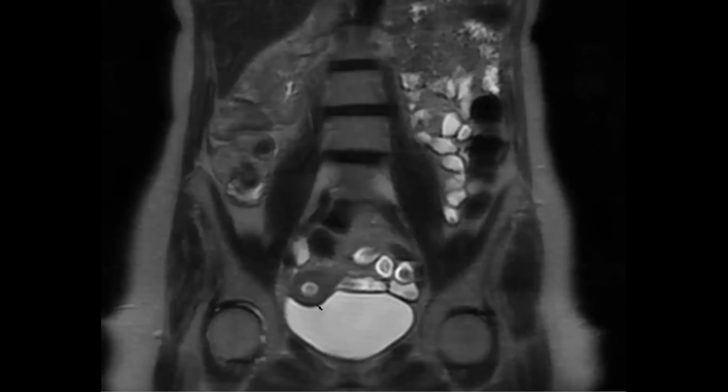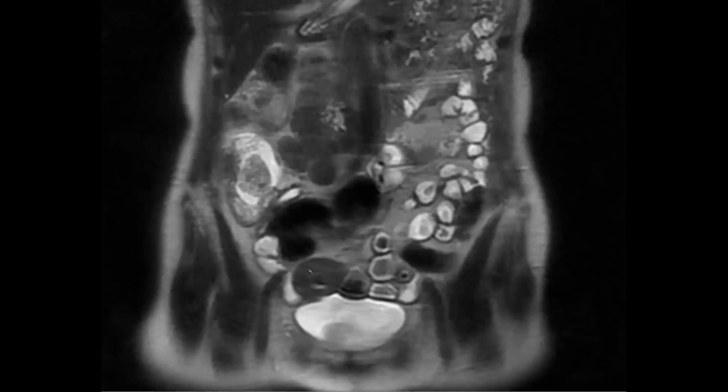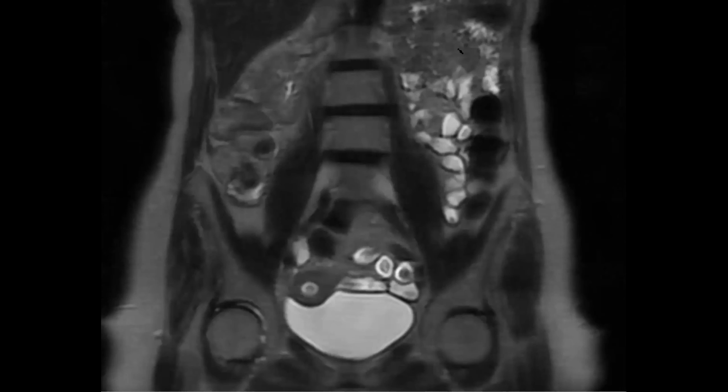And yeah, this kind of thickening without obstructing the lumen is more typical for lymphoma than like a malignancy, but definitely like severe Crohn's disease could be in the differential. The rest of the bowel looked normal.